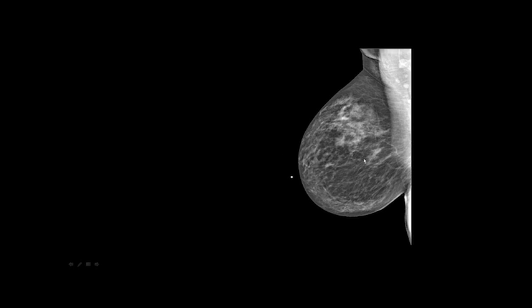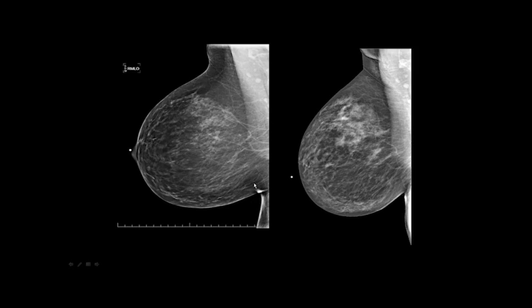The muscle is wide. There is a little convex border and it is down to the level of the nipple. So that's a good portion when positioning on this patient. You can see a few lymph nodes here. But there are four issues here. Number 1, it goes up. Number 2, there's an air gap fold here. Number 3, there's a fold from the breast being pushed up. And number 4, there's a fold in the axilla from the arm not being twisted back.